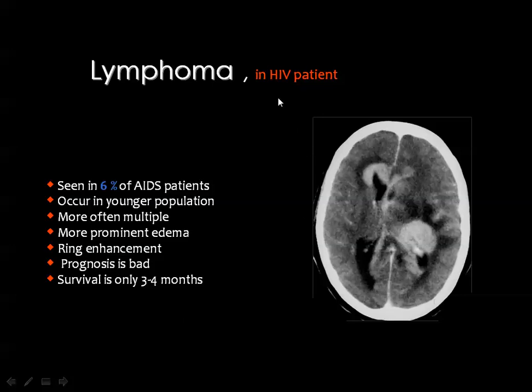And you remember that lymphoma in AIDS patients, as I have mentioned, may be surrounded by significant perifocal brain edema, and it may show heterogeneous post-contrast enhancement. Then we are in the differential diagnosis of tumors and some types of infections which affect this particular kind of patient.